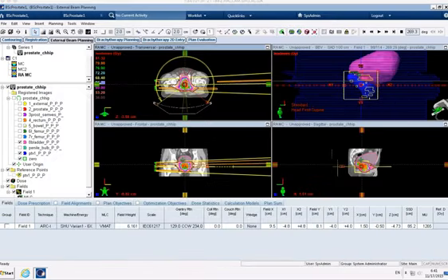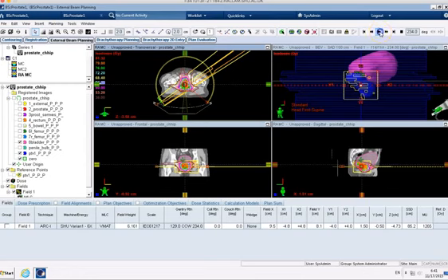Okay, so now everything's in the prescription. I've got a feeling that the plan's still not going to be clinically acceptable, but at this point we can start to have a look at it on the DVH and get a feel for what's in tolerance and what's not. Remember, the DVH that we see in the optimizer is the fluence, but what we're actually interested in is this, what the actual final distribution is on the patient with the leaf sequences.